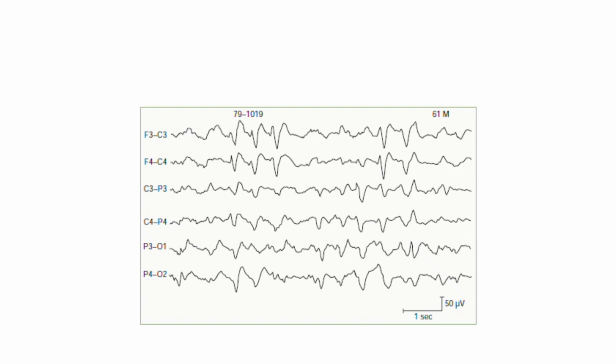The background rhythm between these bursts is diffusely slowed, reflecting a generalized metabolic depression of the central nervous system. 2. Spatial and temporal characteristics. Triphasic waves possess highly specific spatial and timing criteria that distinguish them from focal or epileptiform activity, bilateral synchrony and frontal dominance. The waves occur symmetrically across both hemispheres at the same time.